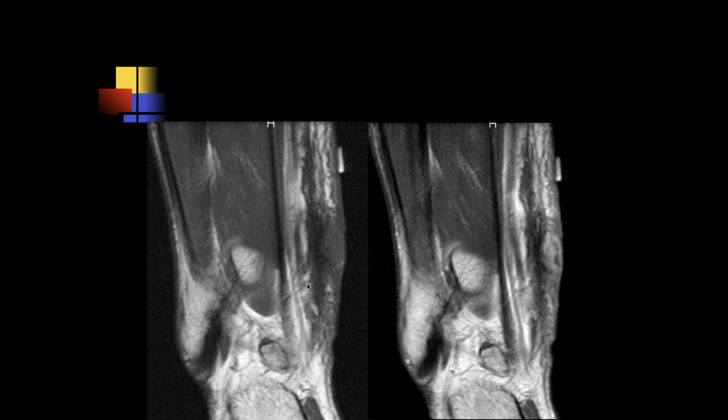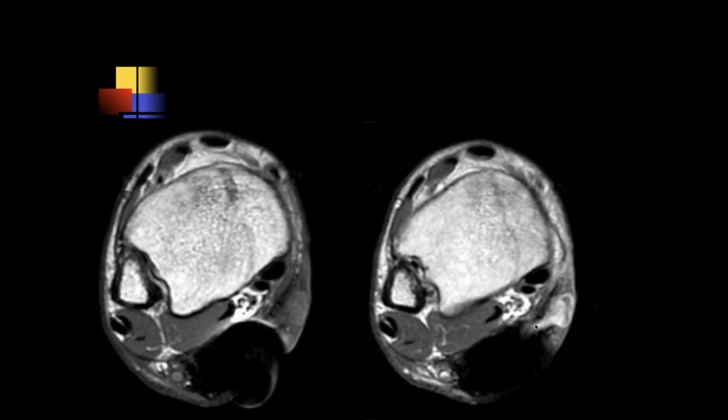Ashu? Sorry, could you orient me here? Where are we exactly? So here's a marker here. Okay, that's a fibula. Looks like the skin marker is along the medial aspect of the high ankle, and there's actually a little bit more distal to that. There seems to be a heterogeneous soft tissue collection superficially, so I'd be worried about a superficial abscess there. A lot of inflammation.